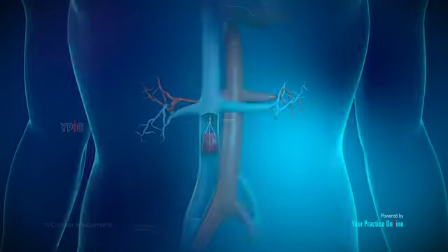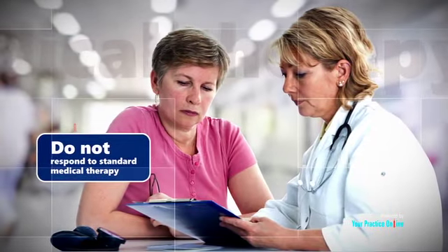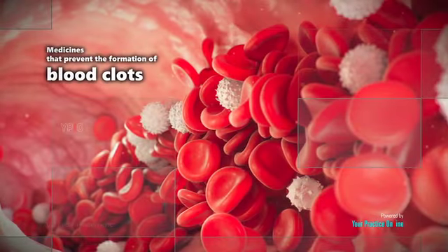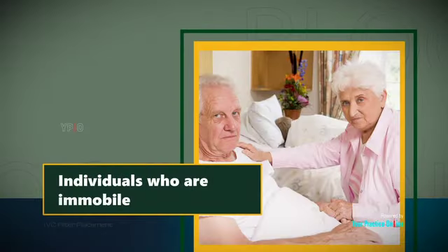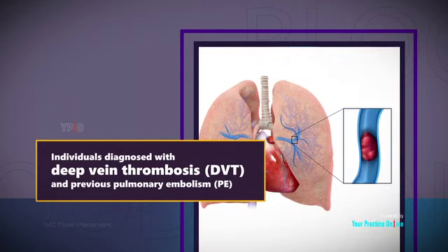Indications. IVC filter placement is indicated for patients who cannot be given or do not respond to standard medical therapy such as blood thinners, medicines that prevent the formation of blood clots. Below are conditions that may prevent the use of blood thinners. History of developing blood clots. Individuals who are immobile. Individuals diagnosed with deep vein thrombosis, DVT, and previous pulmonary embolism, PE.